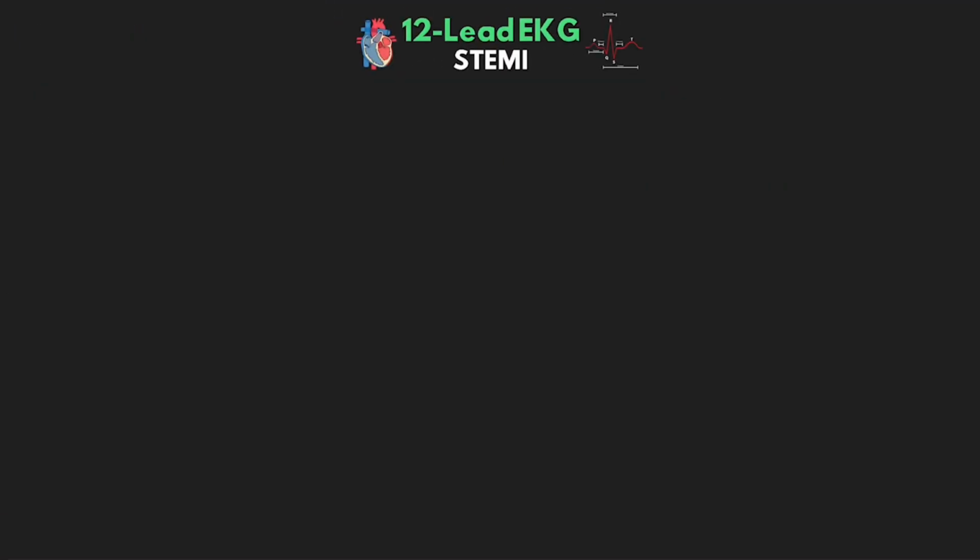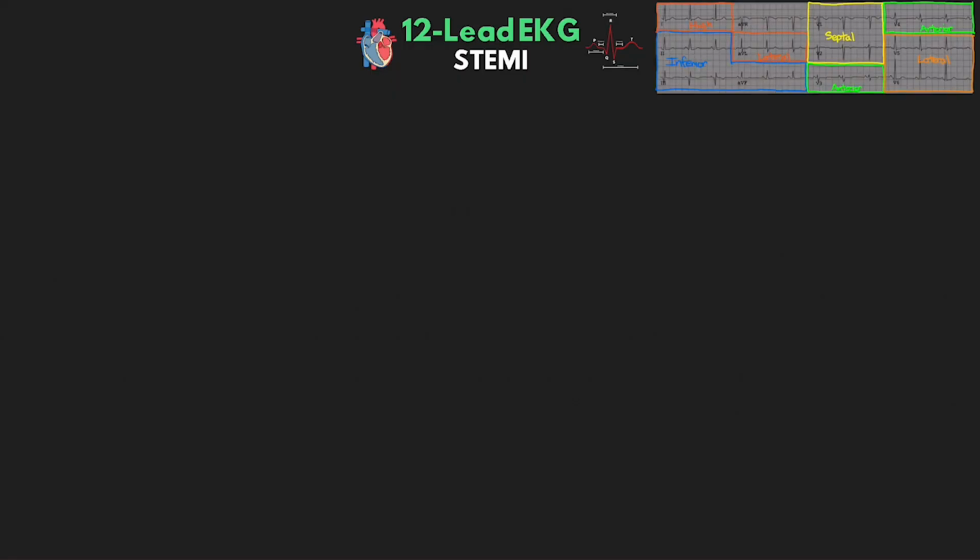Okay, now that we have all that information covered and out of the way, let's start to look at some EKGs of STEMIs in different regions of the heart. And to help with the identification, I am going to keep this chart up top, kind of showing our infarcted regions. Alright, so let's start off looking at our inferior wall.